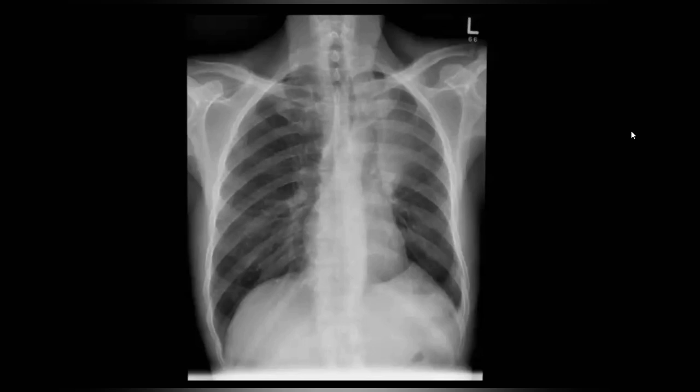However, the mid and lower zones appear unremarkable, and the right hemithorax appears to be unremarkable to me. The region of the tracheal bifurcation at the level of the left main bronchus is not clearly visualized because of the collapse. The costophrenic angles bilaterally and cardiophrenic angles appear unremarkable. The heart lies within the normal range. And regarding the supraclavicular region, the lateral chest wall, and the region of the clavicles and ribs, they appear unremarkable to me.